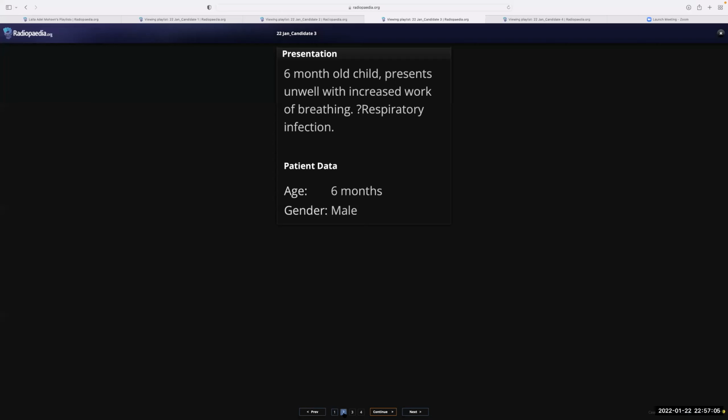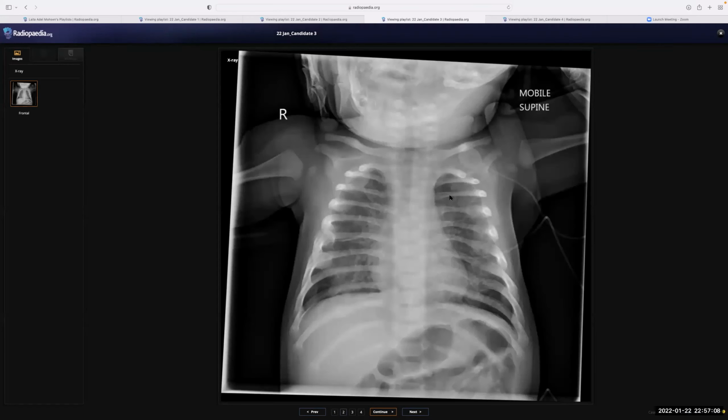So this child, you were right. This is child abuse. Take it in a systematic way, like you said. For example, you checked the lung windows first, then the lung fields, then the costophrenic angles, then the ribs, and when you noticed that the ribs have multiple fractures, you suspected it. So you are right to request the pediatric team, and this is a medico-legal issue. Also involve the child protection services. You also will not allow the child to leave the department.